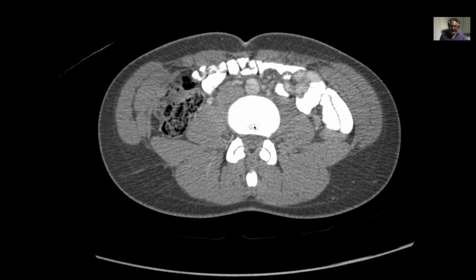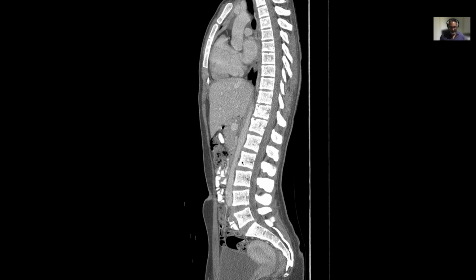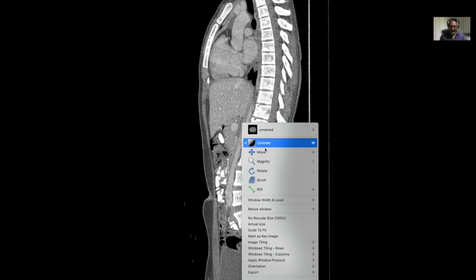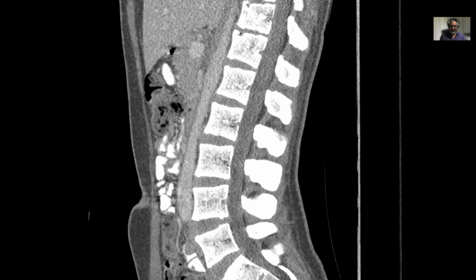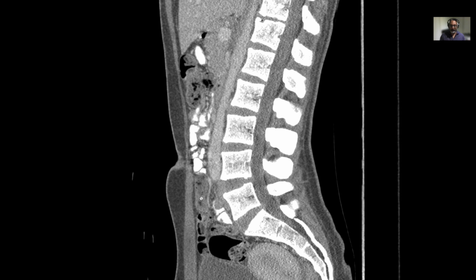I think that really does cover most of the vertebra. I can't think of much more. Let me take you into the sagittal section. Yeah, this is good. Let me just magnify it a bit. So this is a perfect mid-sagittal section. It's really nice to see.